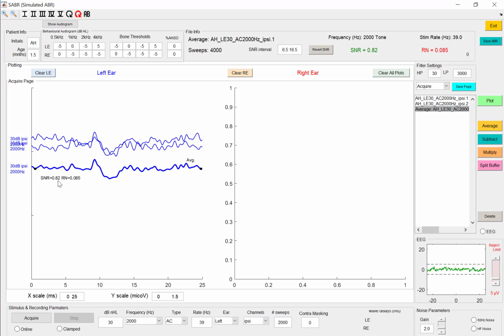You can also move the text in any of the 4 quadrants that you like. And that's the same thing for any of these markers. And we can click and drag that to wherever we want.